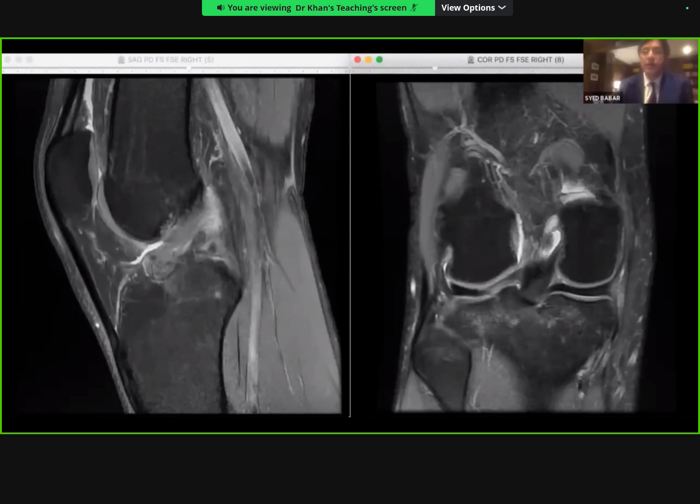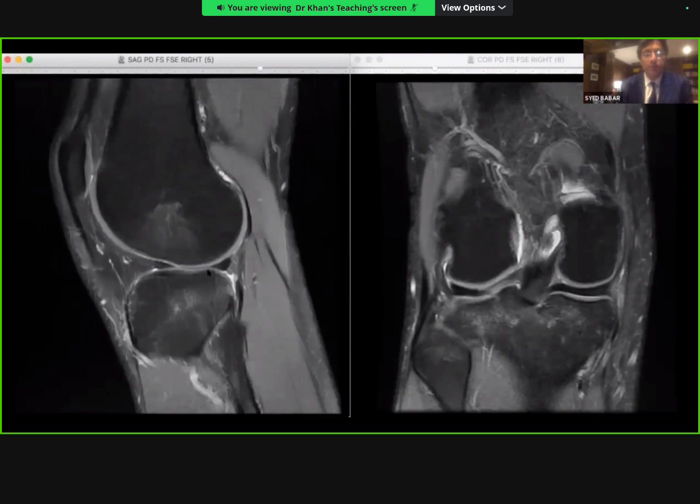So we'll take the control back. I think I can take the control back, stop remote control, so it'll be easier for me to scroll through. Right, so that's a good attempt, but of course it's only less than half the attempt you would expect in an exam situation. So there are lots of findings that you need to pick up.